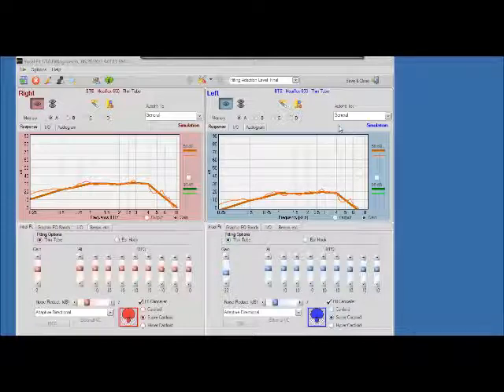In this training webinar, we will be going over how to make adjustments and fine-tune your hearing instrument. In this situation we are working with, well, I'm simulating both sides, and you can tell that we're simulating by the simulation right here. If I had the actual product detected, that word would not be there. In this webinar we're covering what you would do in an instance where you are trying to make adjustments to a hearing instrument. You've already done your initial fitting and auto-fit the hearing instruments to the patient's audiograms.